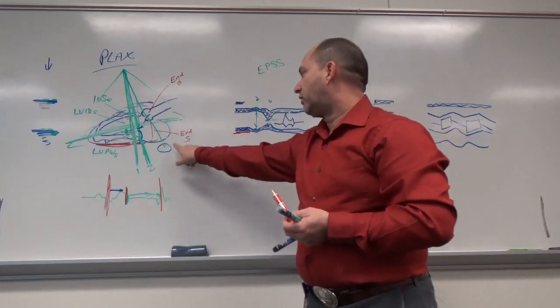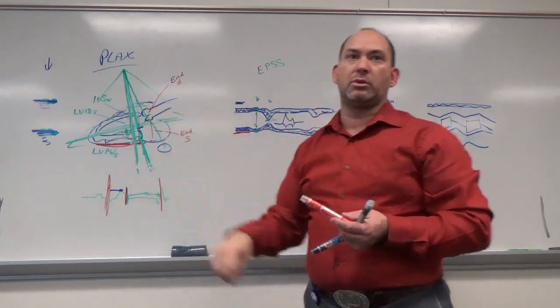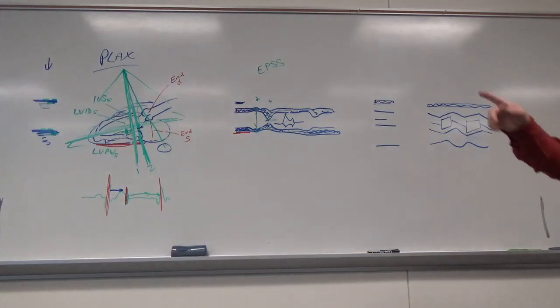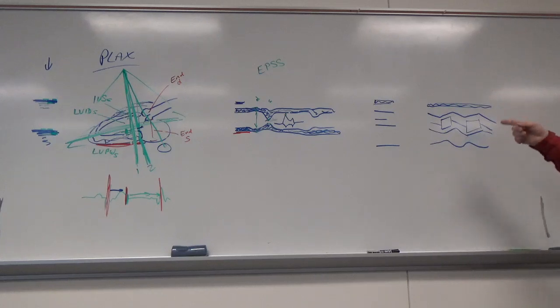Because end of systole is when this is biggest, and this is done at end of diastole when you would measure the diastole of the walls. So you could do the walls and the aortic root in the same one, and you could do systole and the left atria at the same time as well in 2D.